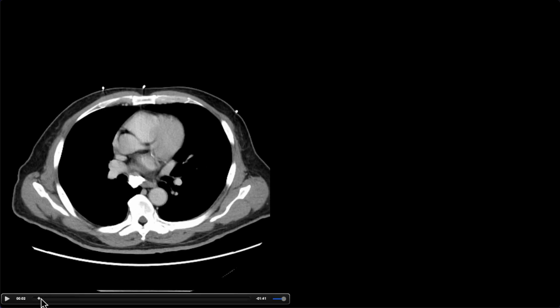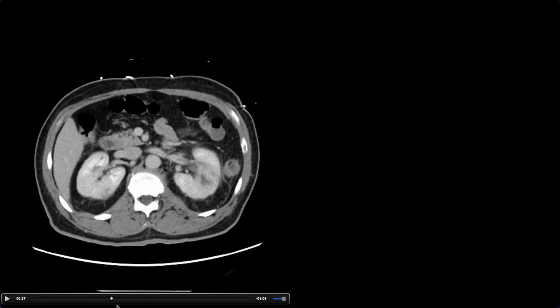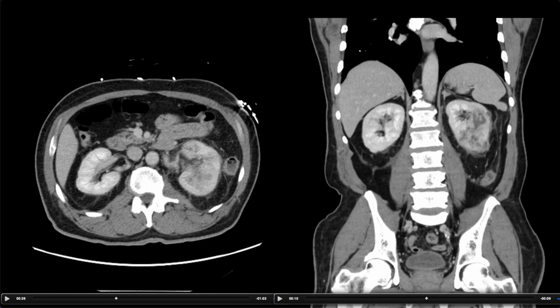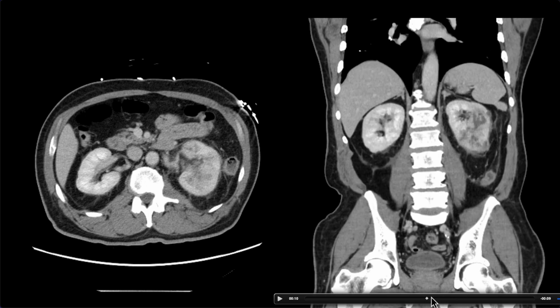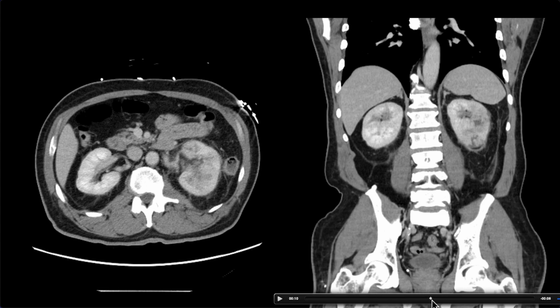All right, next case here. All right, so things are getting a little bit worse now. We're seeing more advanced and more complicated versions of pyelonephritis. So notice how those smaller microabscesses that we were talking about in the last case, now we're seeing the next level presentation of that, where we're seeing larger coalescing abscesses forming here. And then down below here in the lower pole, it's even burst out through the cortex into the subcapsular space and indenting that a little bit as well.